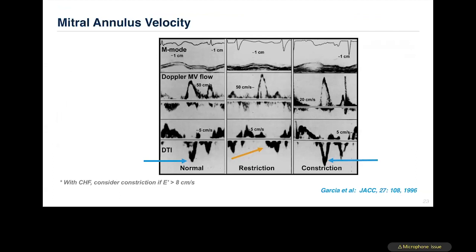They showed an interesting behavior. They showed that in patients with constrictive pericarditis, the mitral annular descent during early diastole, the speed of the descent was preserved, in fact, slightly exaggerated compared to normal individuals, whereas it will be highly attenuated in a patient who would have basically restrictive cardiomyopathy or myopathic process inside the ventricle.